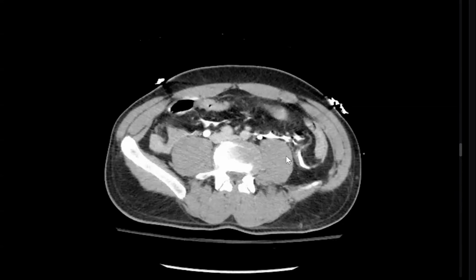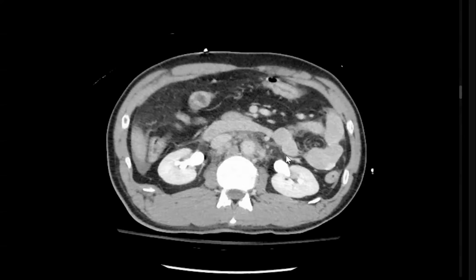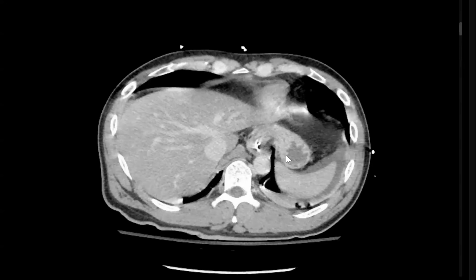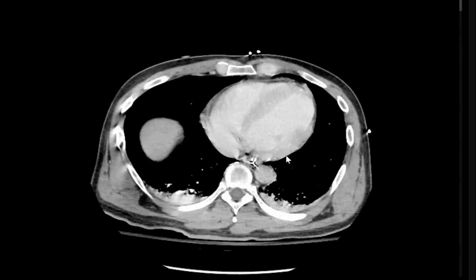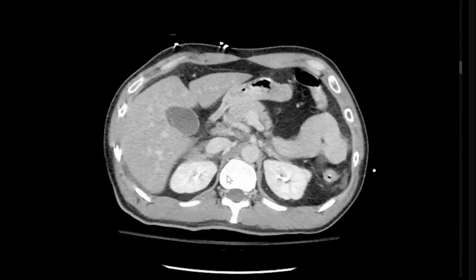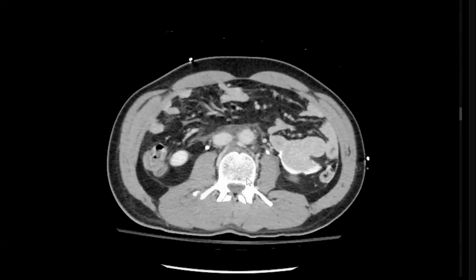This is an emergency to be treated surgically by the urology team, for further assessment of the bone window, and the sagittal for the spine. For further assessment of the chest, in the lung window there is bilateral subsegmental atelectasis. So you would like to refer this patient. Very good. So intraperitoneal bladder rupture, since the contrast leakage is present in the peritoneal cavity along the paracolic gutters.